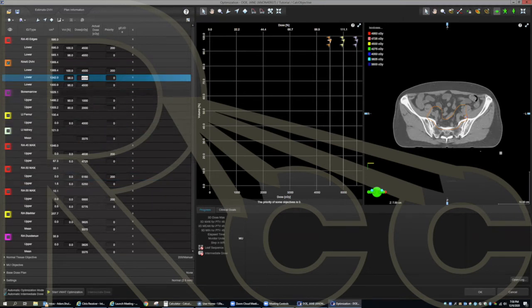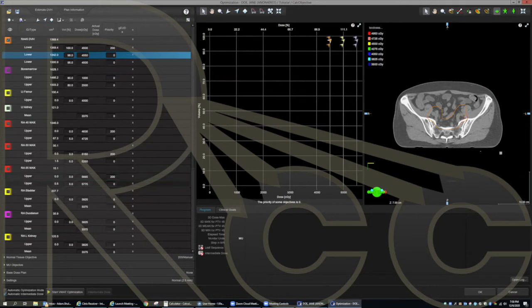Organs at risk have 0 on all of them. I don't put any organs at risk in to begin with. Here are my max doses. So I'll do 0 at 3%, and that's the only one I optimize on to start with. I'll put in more as I go in level 3, as you'll see. And then just something to see, 5% for 105% hotspot. I'll do that for all my maxes. Okay, very similar for all my maxes.